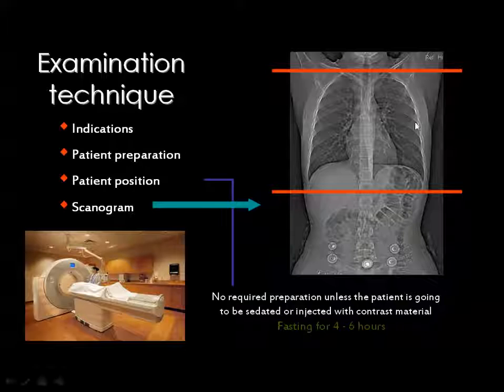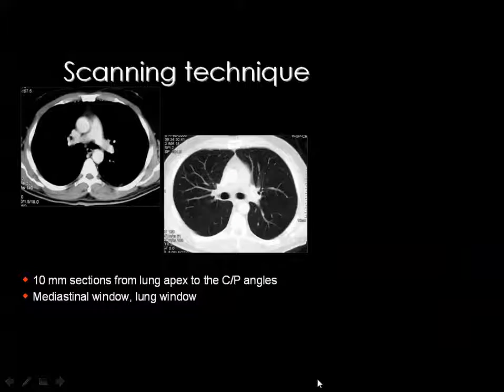If you would like to do so, and I'll show you the indications, then you inject the patient with contrast and you push the button on the keyboard, which signs that you have injected the patient with contrast, in order for this word to appear on the image. Then if you don't like to inject the patient, or there is no indication to inject the patient with contrast, then you say no, and you go immediately for scanning.